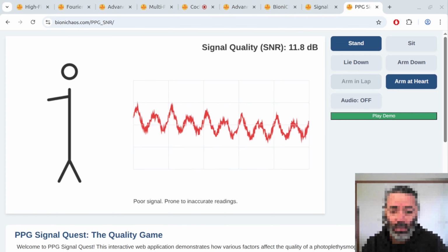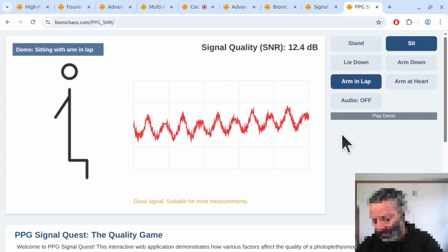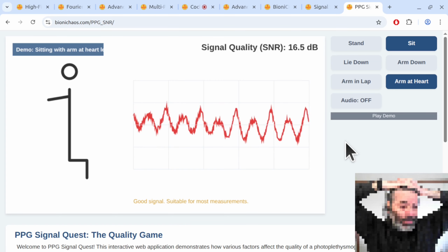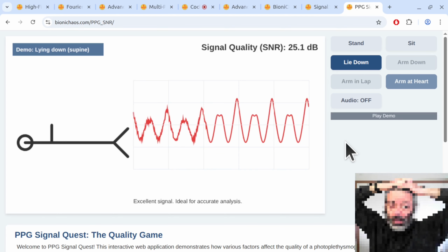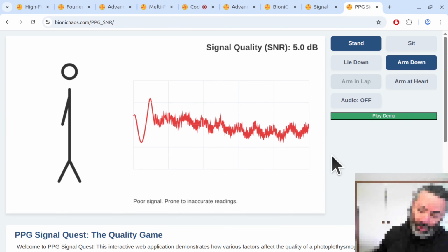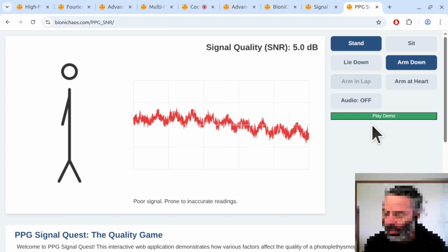Can do content on that as well. Still measuring. Yeah, 95%. It's always showing 95%. That PPG measurement is quite weird that way, because it always varies between whatever 95 to 99%. So the dynamic range is pretty low, I would imagine. I don't know how this device is doing it, or how accurate they're doing it. They're just toys.